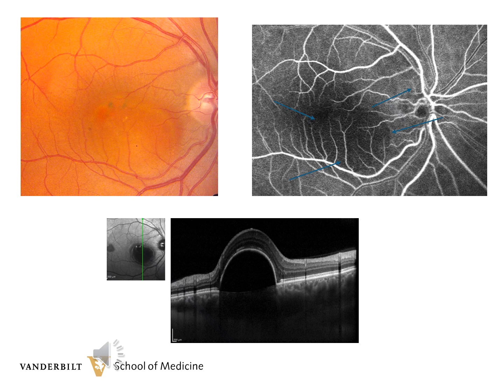This patient has a retinal pigment epithelial detachment. The RPE is elevated as opposed to the last example where it was flat and only the neurosensory retina was elevated. The angiogram shows a subtle area of hypofluorescence at this stage, and the OCT below is a good cross-section of the retina so you can see the location of this fluid quite easily.